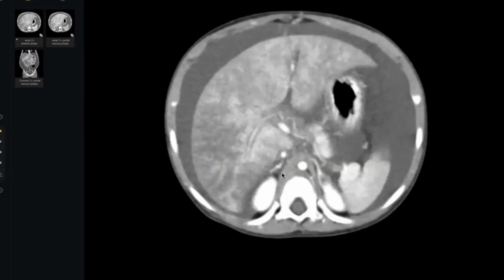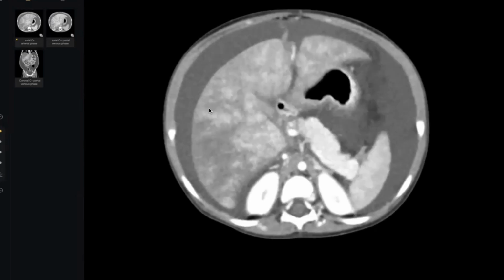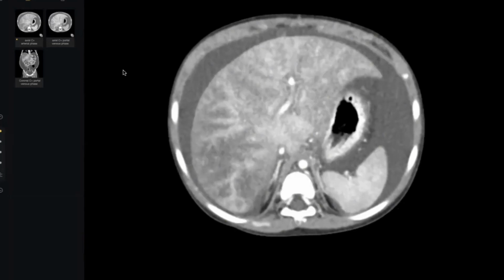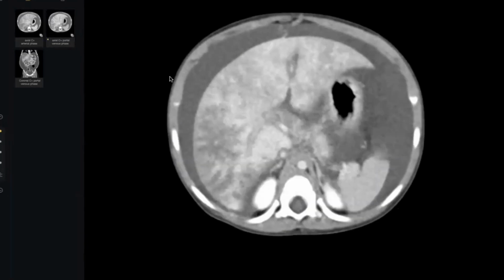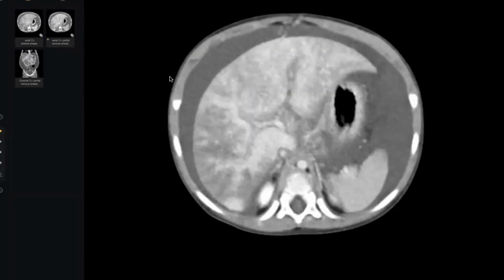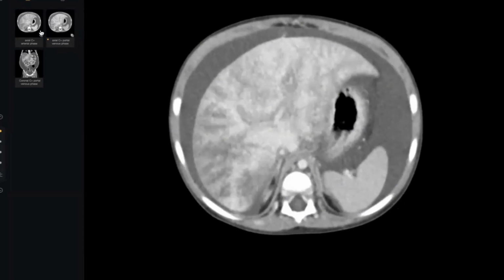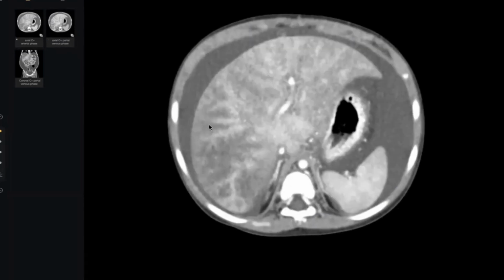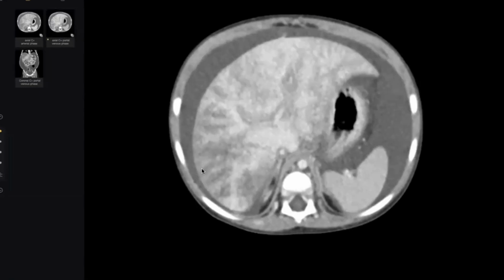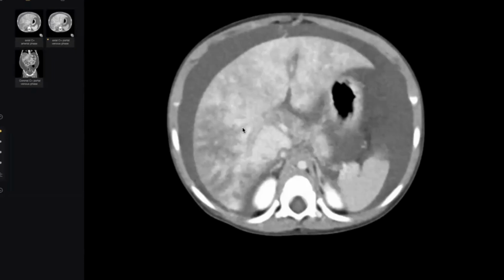Give me the mouse. Which phase is this one? This is the arterial phase. Okay, look, concentrate on the contrast, please. Concentrate here. Look here. What happened? Is there any change? Again, look here. Yes, there is peripheral hypoenhancement, and mainly central enhancement here. See here, what happened? There is peripheral enhancement and the opposite.